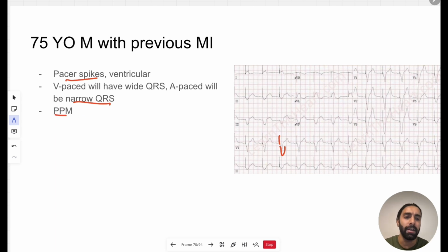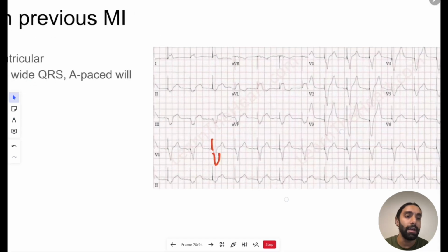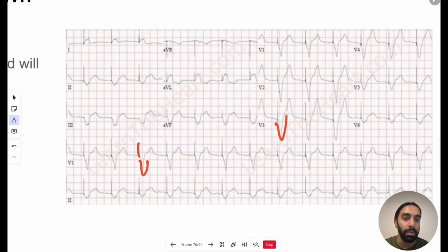If the QRS is abnormal, then the T waves will also be abnormal because that's repolarization of the ventricles. That's called discordance, and that's a typical finding. There's nothing like a STEMI that's happening, although there could be. It's hard to tell. It's not that sensitive with patients with these types of pacemakers to come with any findings like STEMI or non-STEMI.